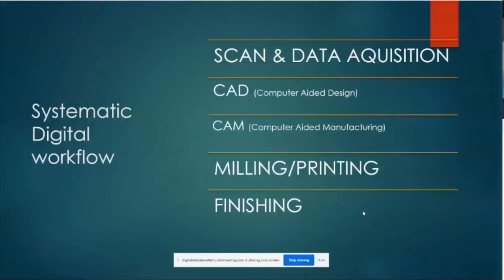Okay, basically what we'll talk about today is, before creating a surgical guide or a temporary or whatever, we need to understand the digital workflow. So in the digital workflow, regardless of what you're doing, you will bring your scan and data acquisition. That's how it starts. Data acquisition can be a scan of your patient, a scan of your mouth, a scan of the face of the patient with a facial scan, whatever, and you will have all these models. Okay, so once you have all your models, then you will align them together.